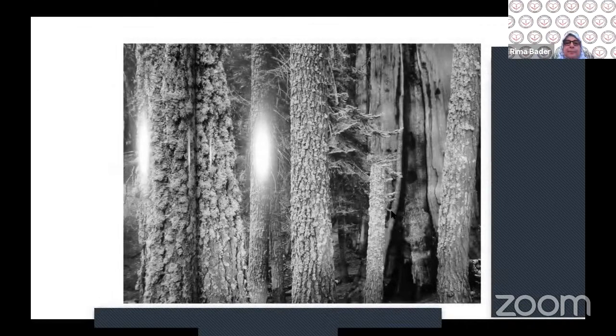So I'd like to finish by showing this slide and saying, we can get a lot of information on 2D image, and black and white photography is actually quite nice. But I think if we add color to the heart, we do get additional information, and perhaps we see some things slightly differently. And of course, we can do the two things. We can split the image and look at the information with or without color.